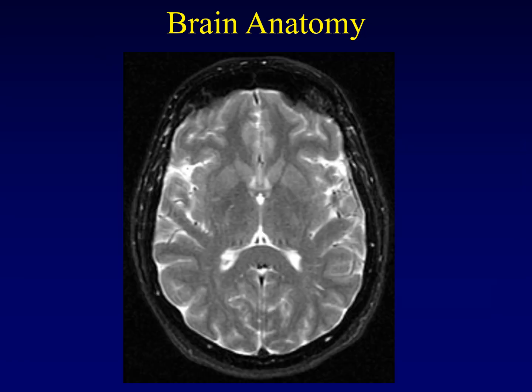Now that we've seen the anatomy on CT, let's switch over to MRI. We're going to play the same game here because the anatomy is all the same, just the colors have changed. This T2 weighted axial image from an MRI is aligned pretty closely with one of those CT images that we were just looking at. So all of the anatomy is going to be the same, just the colors are going to be different. Let's run through it. What is this really white, brightest thing on the image here?